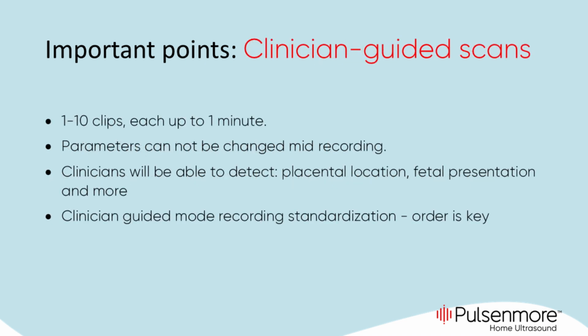Clinician-guided scans may contain between 1 and 10 clips, depending on how many recordings the clinician chooses to make. Each clip can last up to 1 minute, which may require additional upload and processing time. Parameters cannot be changed during recording. Clinician-guided scans allow clinicians to identify placental location, assess fetal presentation, and gather additional clinical insights.